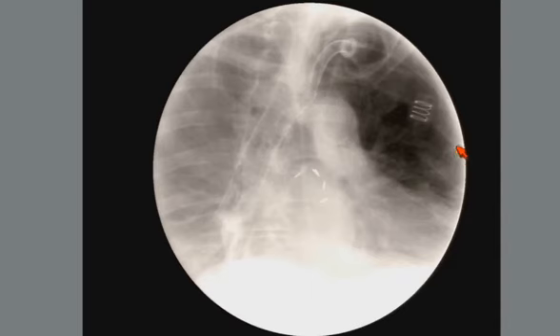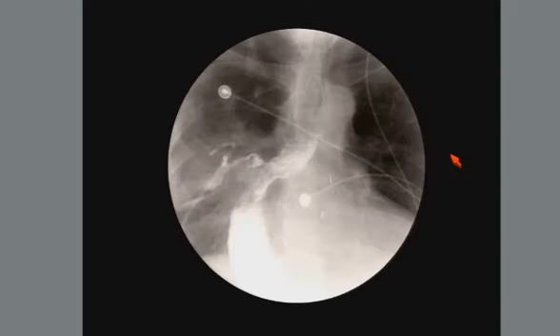These leaks that communicate with the airway are typically treated with a covered stent placed by the endoscopist. We're often asked to evaluate these and make sure that the leak has sealed off. In this case, it did. We saw no more communication with the airway. But these stents are a little bit problematic because the distal end is not well seated in that gastric body, so it tends to move around. They often pass spontaneously into the stomach, and that's fine. They're retrieved.